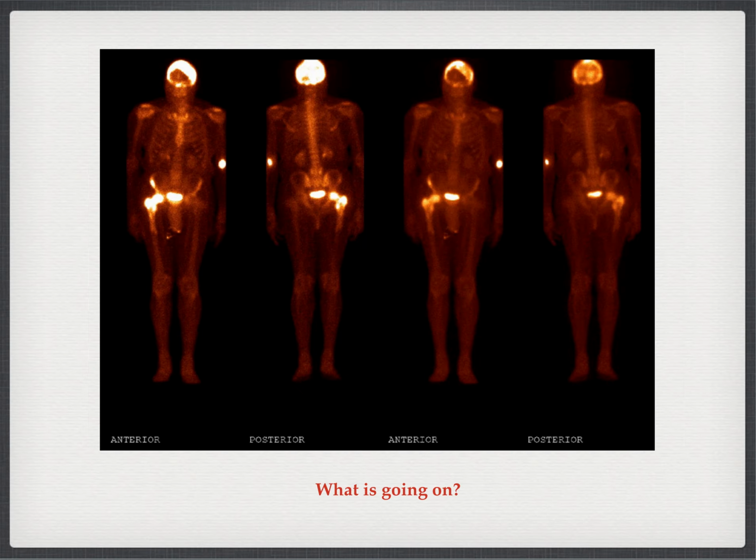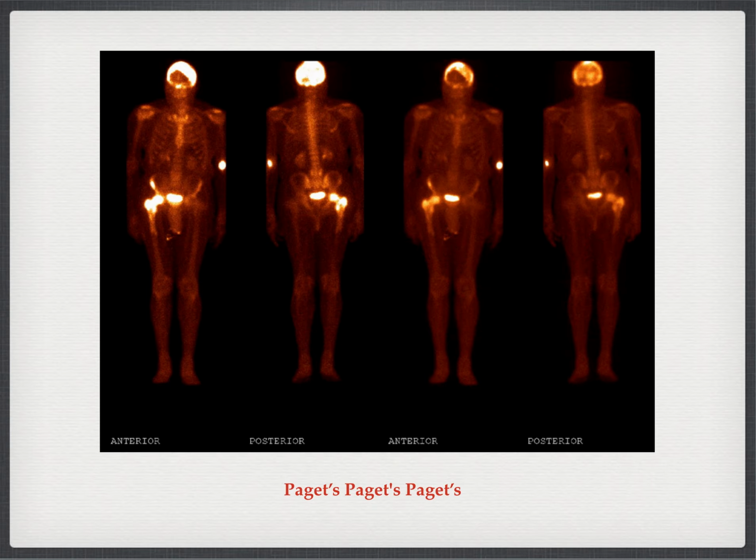All right, this is another common disease that is always nice to diagnose in the bone scan. Who can tell me what this is? Well, I'm sure everybody got the right answer. This is Paget's. And we see this convoluted uptake in the skull and pelvis. And the appearance is really characteristic. So once you see it once, you can't forget, and you'll be able to diagnose it confidently.